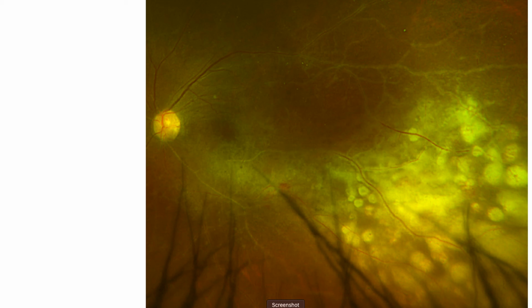And so that patient was a 57-year-old woman with relapsed leukemia. She was immunocompromised. PCR showed that she had Epstein-Barr virus retinitis, which you can see here as retinal whitening. She also had subretinal infiltrates, probably leukemic. She was treated with intravitreal foscarnet and chemotherapy.